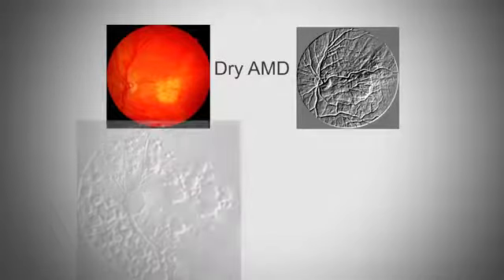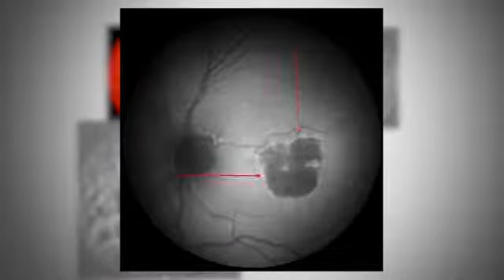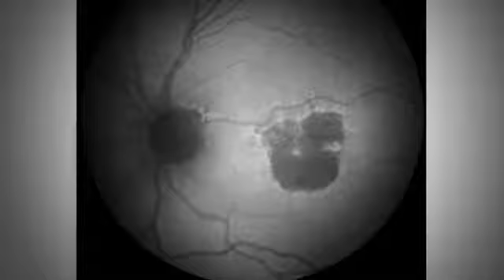When we did the autofluorescence, what you'll notice in this particular case is you have an area around the black area, and we talked about this, that 256 shades of gray are seen here, and each one tells you a different story. The black simply says that the area is dead. Gray tells you that it's dying, it's in the process of dying. White tells you it's progressing rapidly. So whenever you see an area that is white, concern should be raised.